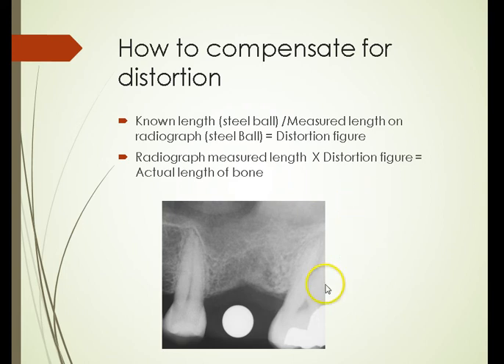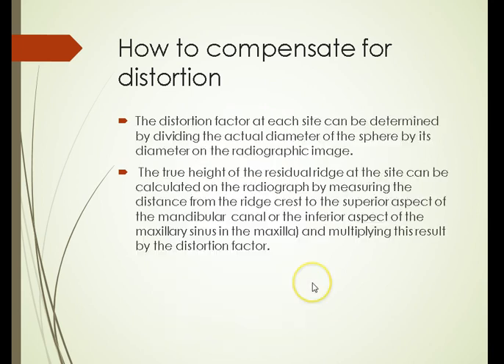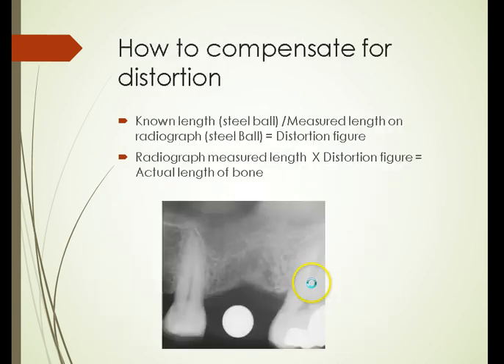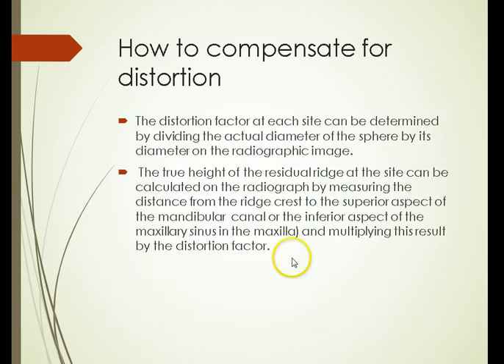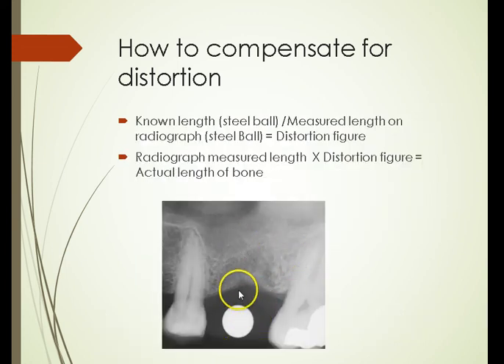method of evaluation. And in this case, let me show you what I use. We made a clear, I use a clear and then put my metal and kind of glue it in the area so you can see it within the field of view and we can measure it out.